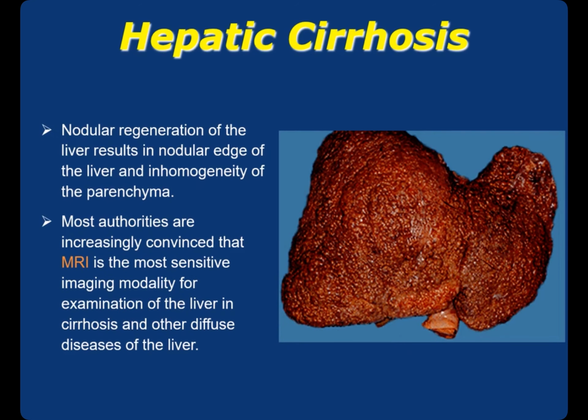In hepatic cirrhosis, we can see nodular regeneration of the liver resulting in nodularity of the liver and inhomogeneity of the parenchyma. MRI is the most sensitive imaging modality for examination of the liver in cirrhosis and other diffuse diseases of the liver.